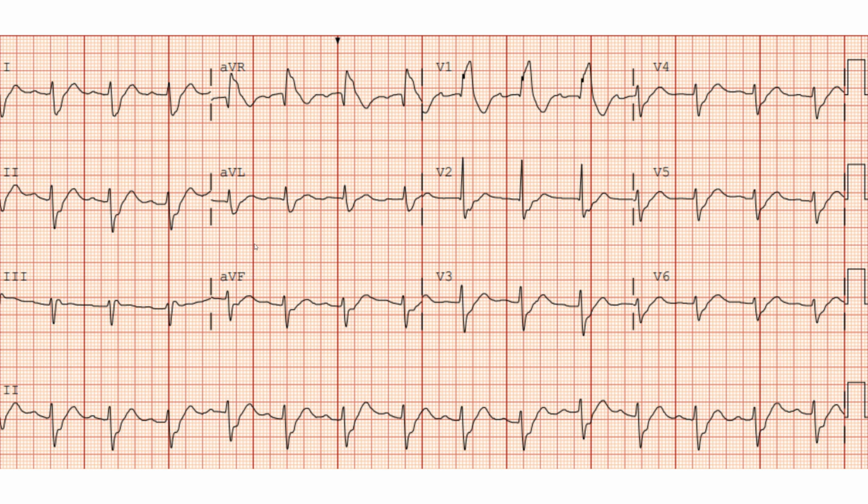The other interesting thing we have on this EKG is we have a pretty big S wave in lead 1. Okay, technically, you would qualify this axis as indeterminate because it's down in 1 and aVF. But the thing about a right bundle branch block is normally you do have an S wave in lead 1 that's wider than the R wave, but normally the S wave is smaller than the R wave. And that's not the case here. You can see that he's got an R wave that's smaller than an S wave. And people call this indeterminate axis, but for me, anytime I have a large S wave in lead 1, I am calling that right axis deviation. Okay, and I'll get to that in a little bit.